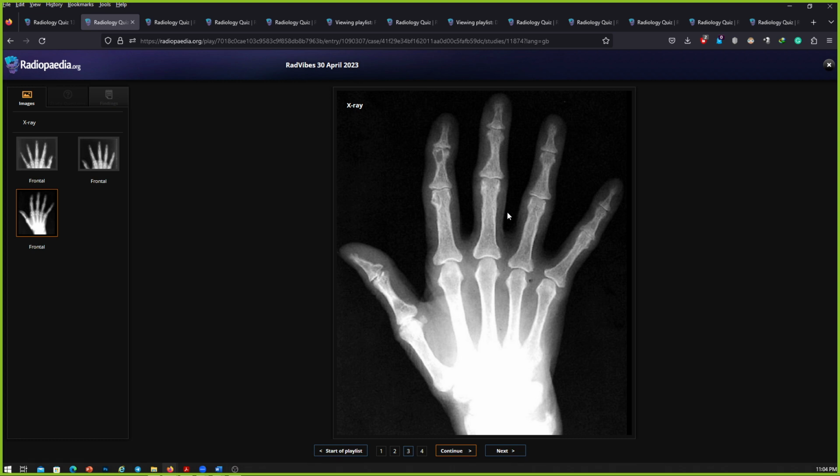Okay, so this is an AP view of the hand X-ray of an adult patient. I can't see the right or left marker. However, there is a lucent, lytic lesion within the middle phalanx of the second finger, along with diffuse acro-osteolysis involving the distal phalanges, and there is also subperiosteal scalloping seen at the radial margin of the middle phalanges of the fourth fingers.